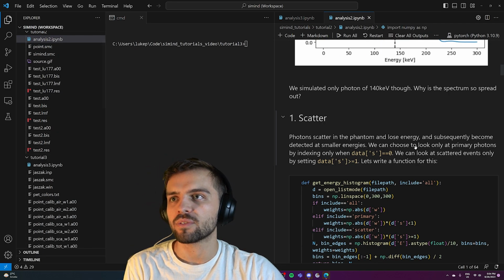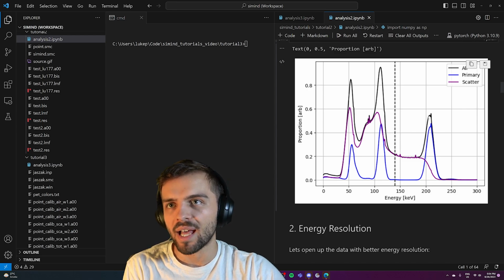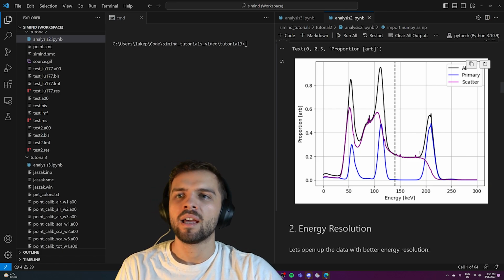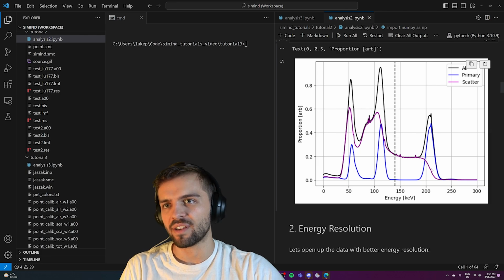So when we're looking at the lutetium-177 spectrum here, we have access to the black curve, all of them, but we don't know the scatter, this purple in the middle here. And we want to go from black to blue. We want to get an estimate of only the primary events, right? And so we need a way of determining what the scatter is here in the center.